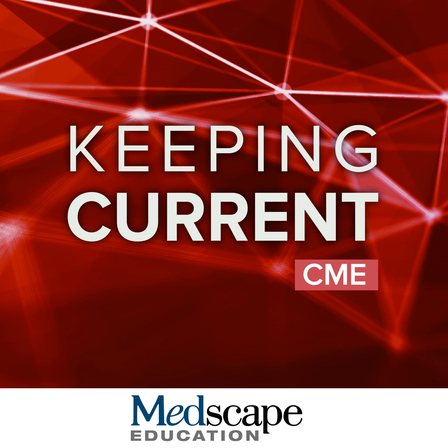So first of all, let's talk about the CMR techniques. The beauty of MR is that you can run multiple MRI techniques in the same protocol, and these are all illustrated here. We can do dark blood imaging for looking at anatomy. We can do cine imaging for looking at function. We can inject contrast and image perfusion in the heart. We can look for scar in the heart. And then anytime we inject contrast, we can also look at the blood vessels with angiography.